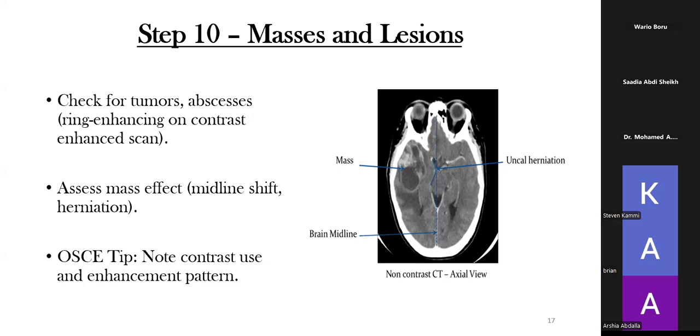Start at the base of the skull. Any bony fractures, look at the soft tissue quickly. Then go in levels, start in the brainstem, lower foramen magnum, lower medulla, upper medulla, pons, midbrain. Then you quickly go to the cerebellum. Cerebellum, look at 2 areas. The hemispheres, look at the vermis. Discuss any asymmetry, loss of folia, any hyper or hypodensities that are there, and where it is located. Quickly come to the cisterns. Are they effaced or are they normal?